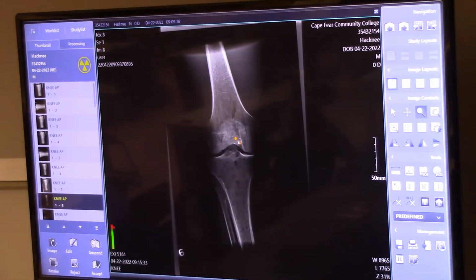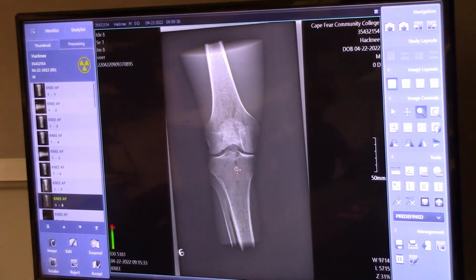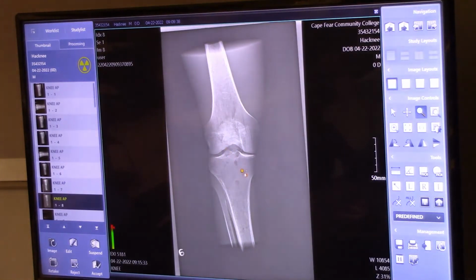Okay, now what happened? We're scorched. We're burnt out. Look right here, we burnt out the bone on that medial margin. That's what the doctor's going to ask. He's going to say, look, did this patient have, are they really eroded to this point? Was their bone sticking out through their skin? Well, it wasn't, but it is now. Yeah, exactly. It is now.